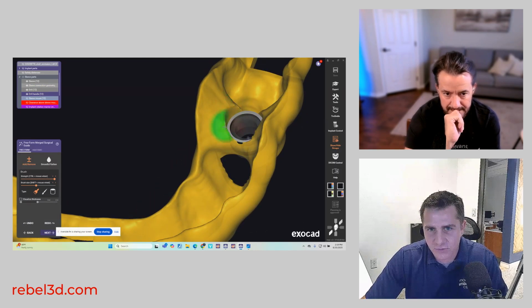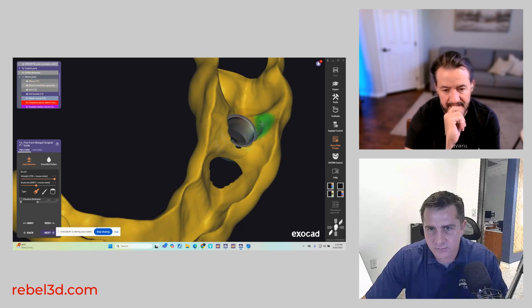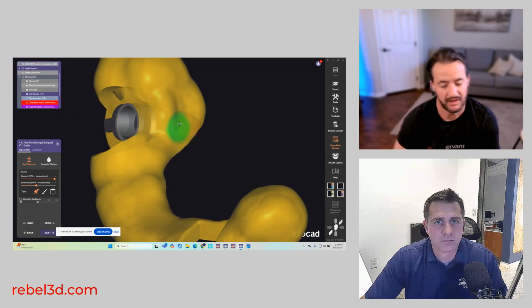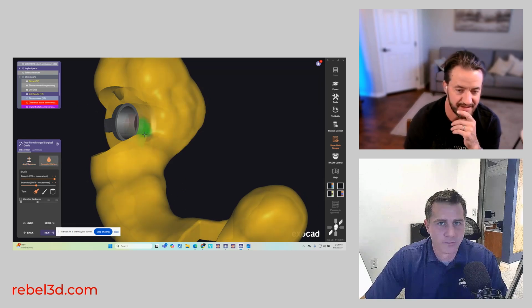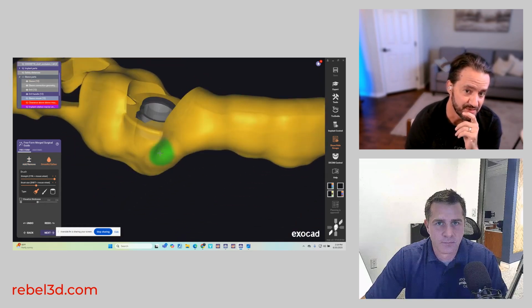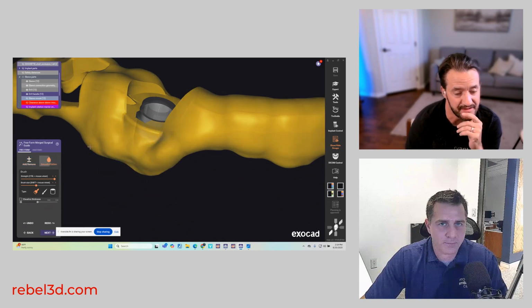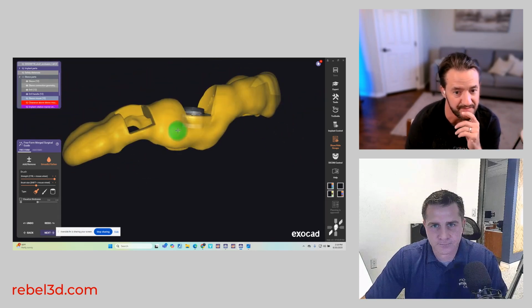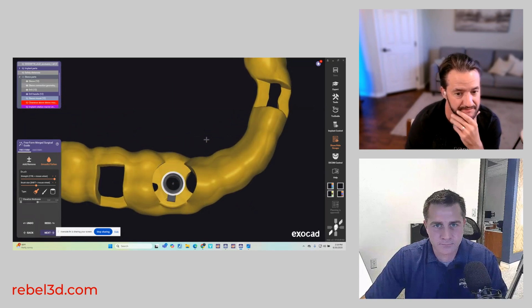Hmm. So there's your answer. Well, my guess is there's probably a workaround somewhere out there on the interweb. So if anyone's watching this video and knows a way to make a sleeve stop, I'd be curious about that. I'll ask some of my friends. But my guess is it's preventing you from getting material in there on purpose in this phase.